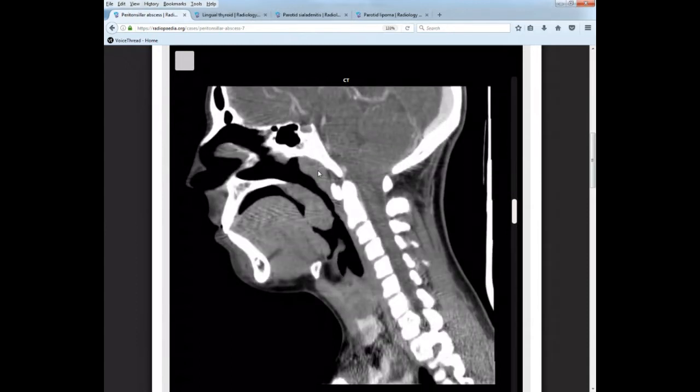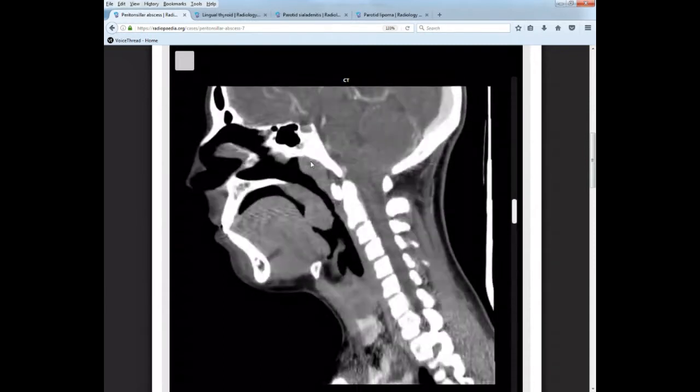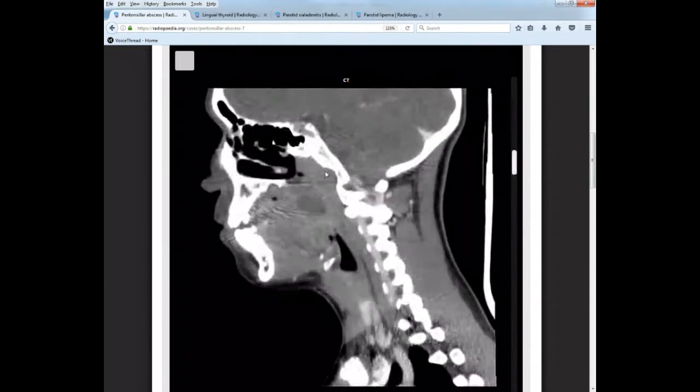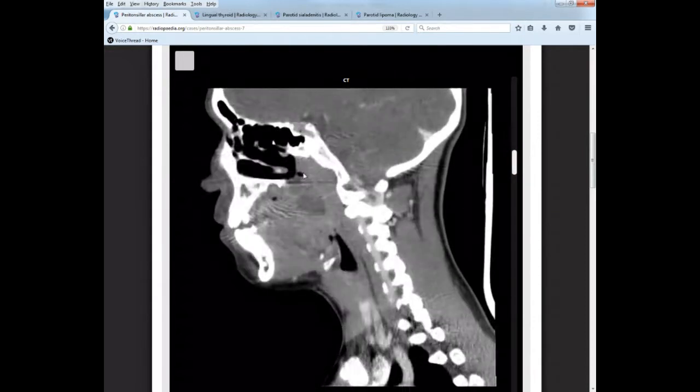Next we have the eustachian tube openings, which is this study. You can see it on, yes, I believe this. So see this little dot here and this dot here. So remember that the eustachian tube opening is in the nasopharynx. They are posterior and laterally and then travel up. So this is one slice, we're seeing it on end. And then here it's traveling up and exterior, laterally out towards the ear. So there's your eustachian tube, okay?